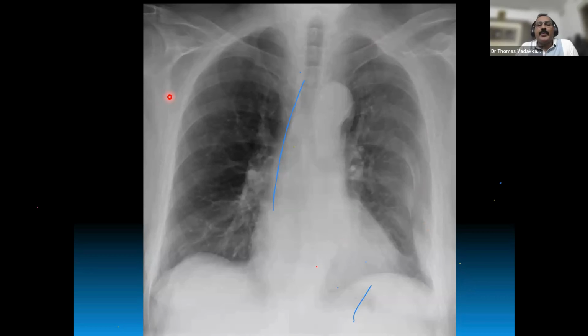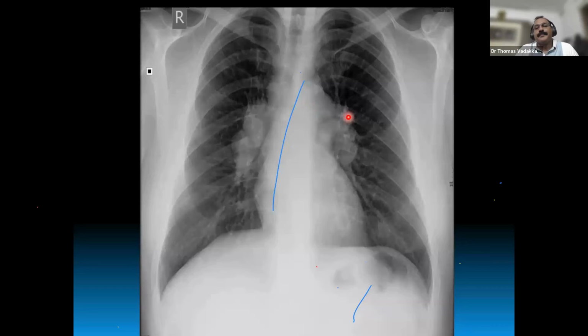So that's the beauty. You have to see all the bony structures one by one. Then only you will be able to diagnose fractures. Sometimes the patient might present with a pathological fracture of one rib. They will have intractable chest pain, inspiratory pain, pleuritic pain. But unless you are looking at each rib, you will miss the diagnosis. So always keep an eye on the ribs whenever a patient presents with pleuritic kind of pain.